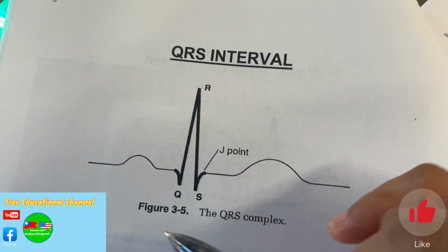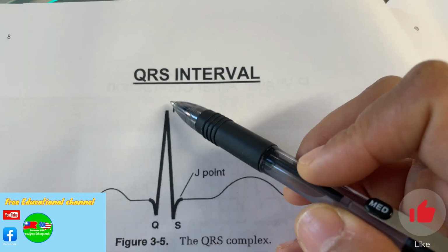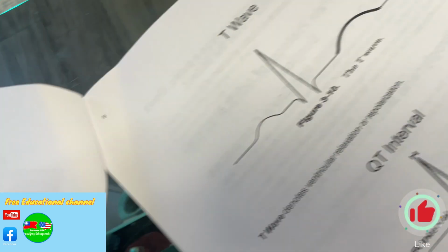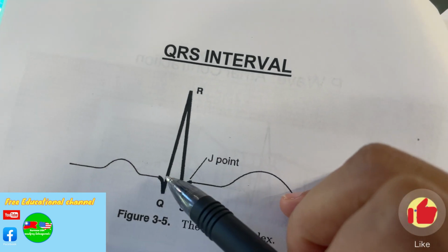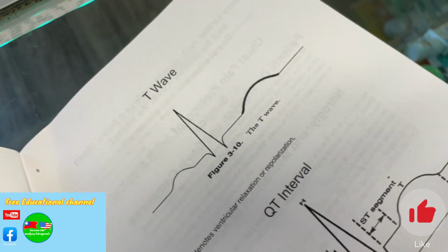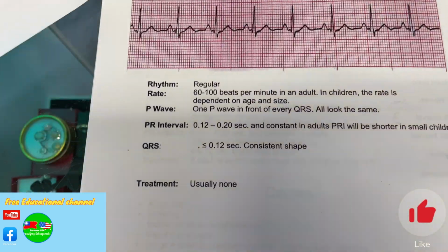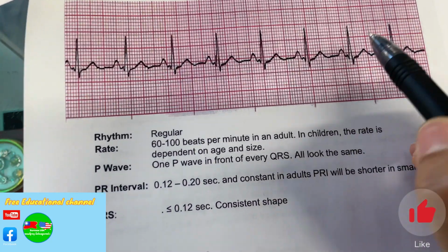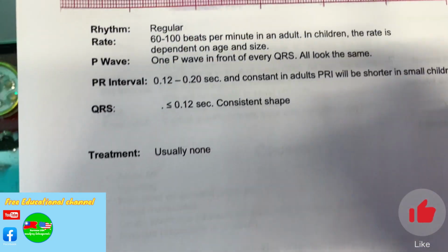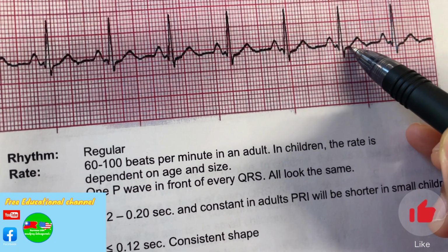So QRS starts from the Q, then R, and S. It ends at the end of the S. That's what QRS is: starting from Q and ending at the end of the S. So look at this. QRS right here ends at the S, until here.